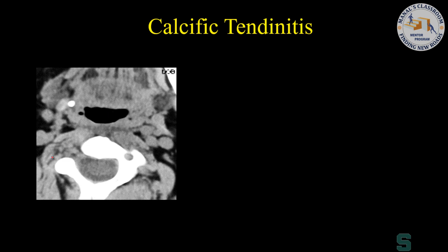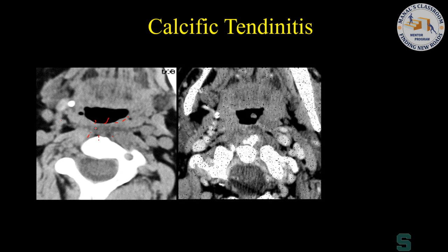Okay, all right. So let's take a look at this here. So, what am I pointing at right here? Do we see anything back here? Aha! What is that? Edema. Edema. So now you have someone that presents with edema involving the retropharyngeal space. So let's look at some more images.